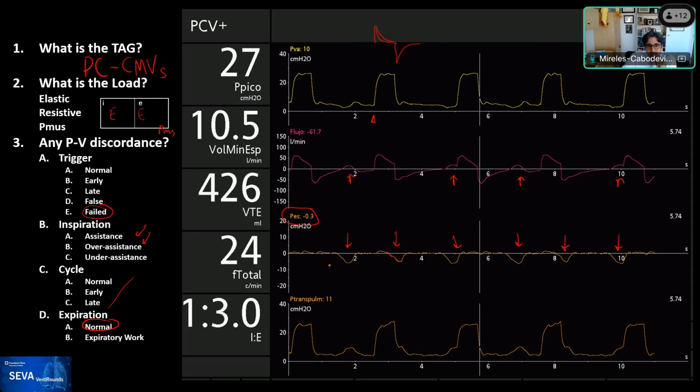All right, minus the pressure outside. So this is the pleural pressure, or a surrogate of the pleural pressure. And so what you will see here, the pressure during this part is essentially zero. So the pressure in minus the pressure out, because there was no pressure there, the pressure remained about the same. So you can see that the waveforms are almost identical.